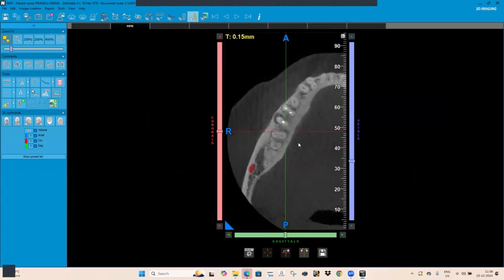So see. Now can you see one thing here in the distal root? This is the distal root of this particular tooth, 4-6. So after a certain point, till here the radiopacity is seen at 2 places. After that, it fades out and then nothing is there. So now we get an idea that there is root patency here in this canal. Now we get this idea from the axial section. Now we will locate this canal.